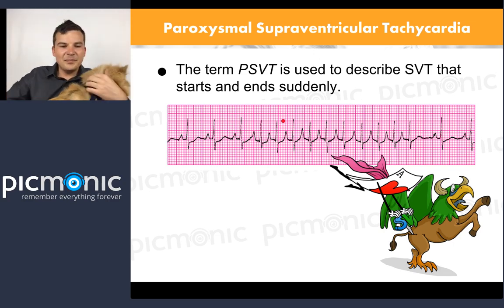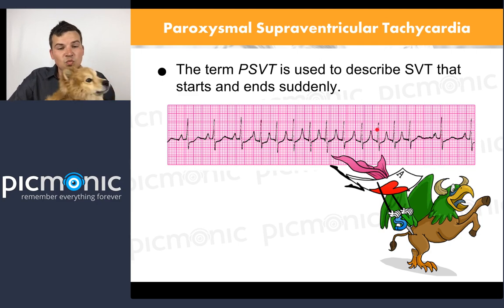He's not happy. So then I have a tiny space right across here. That's absolutely right. So it's regular in the middle, but it's too fast. If you just took this section and multiplied it times 2, then you've got a really fast rate, right? But then somewhere right along this space, it gets normal again. Here it looks just like it did before. So it was doing something normal.